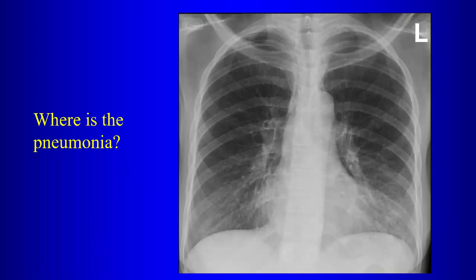Left upper. Where in the left upper lobe? Because we lose the heart. So we need a consensus opinion here. Do we think this is normal? Do we think there's a pneumonia? There's a pneumonia, but where? Left, because we're losing the left heart border, so left.